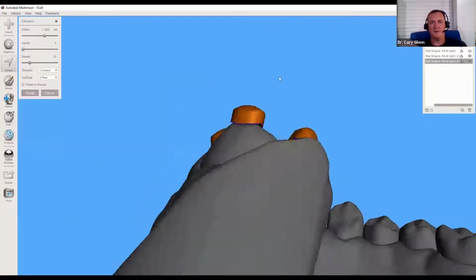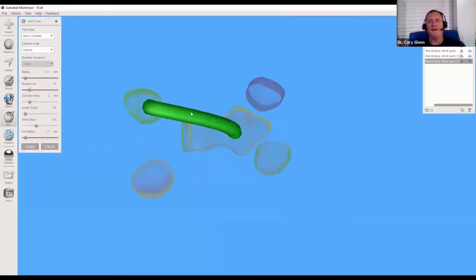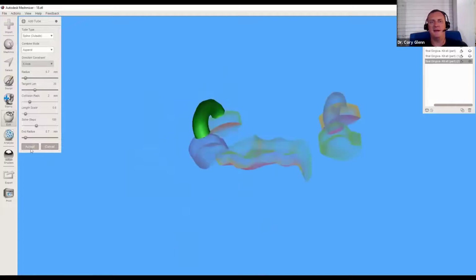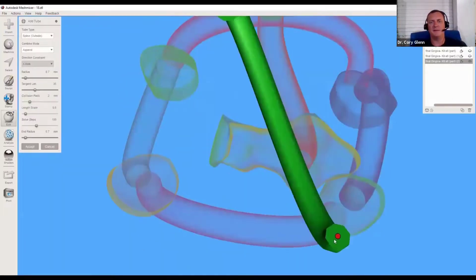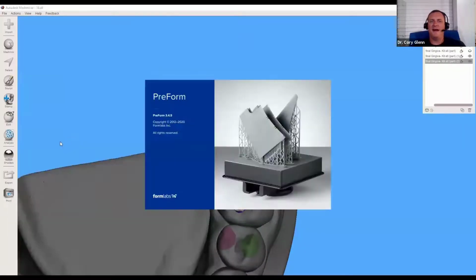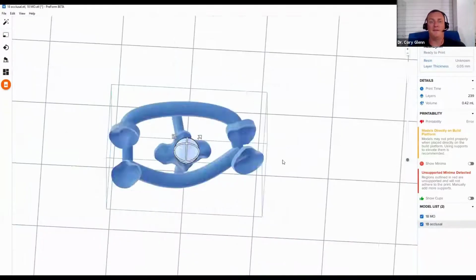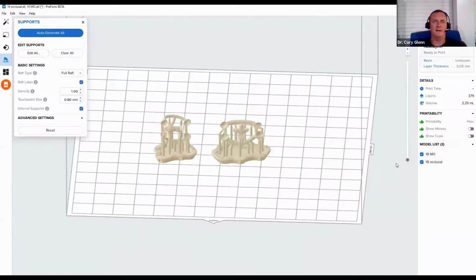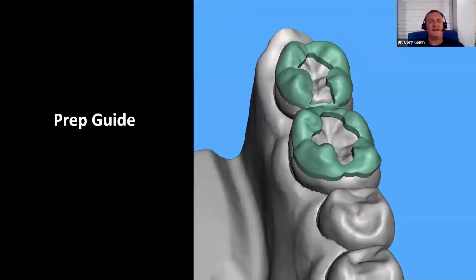And this is, again, the beauty of 3D printing. There's no way you can mill a shape like this. But I've gone ahead and pre-made an inlay filling. So it's highly cured, it's extremely strong, it's stronger than your direct composite. And then I can print these ahead of time. And you could do a whole quadrant or a whole mouth of these. Again, you're talking a milliliter of resin, so it's $1. It's not a big deal. So I time-lapsed that, obviously, because that's a little more involved, but I'm just trying to show you what's possible.